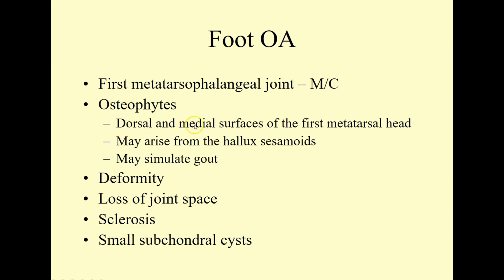Osteophytes again, both on the dorsal and medial surfaces of the first metatarsal head. We also can see the sesamoids under the big toe, the hallux. Also demonstrates some degenerative change as well.